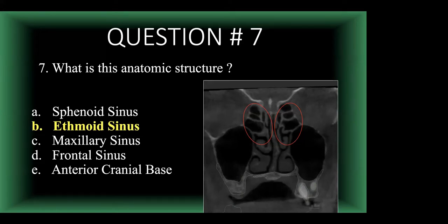So you can see this can get into a real bad situation where you end up with an ethmoid sinusitis secondary to an implant or a bone graft. So that's why it's important to determine and make sure that that maxillary ostium is patent. So the answer is B.